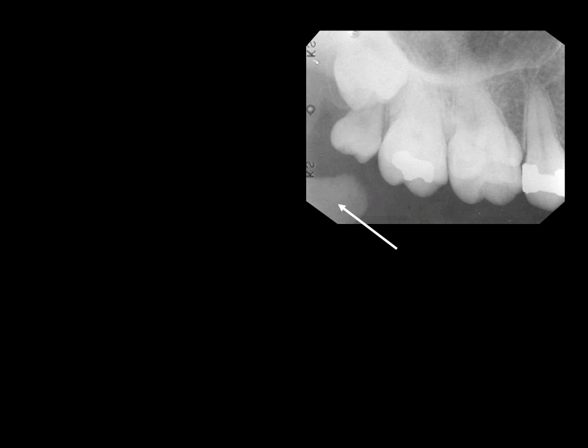This radiograph shows again the same region. There is an interesting finding here, because if you count the number of molars, you should identify 4 molars, which is one additional to the normal number, and we have a supernumerary third molar present. Indeed, the erupted third molar is probably the extra tooth, and the unerupted tooth is probably the real third molar.